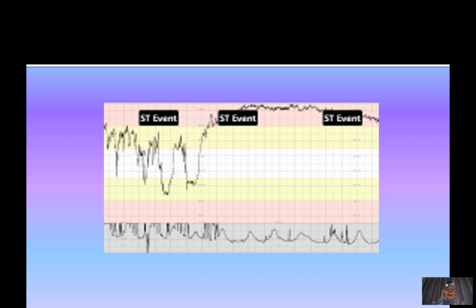Okay, please take again a few seconds to look at this CTG. So here we start again systematically with the contractions. You see 3, 4, 5, 6, almost 6 contractions. So 5 to 6 contractions in 10 minutes.